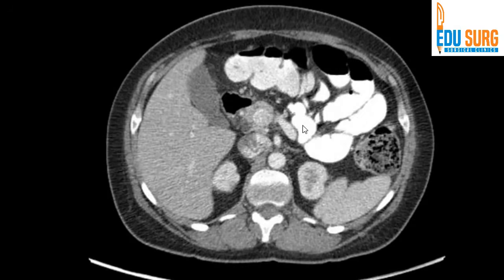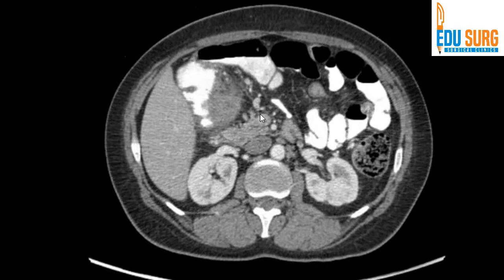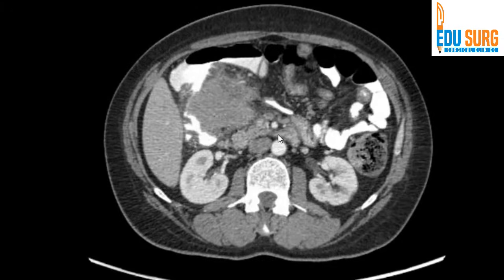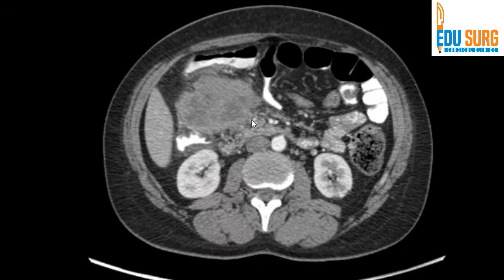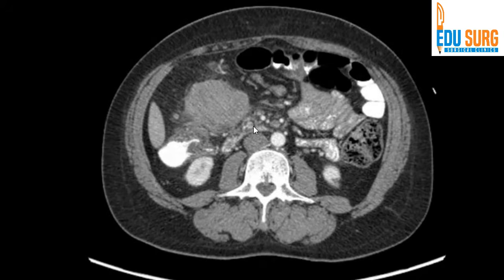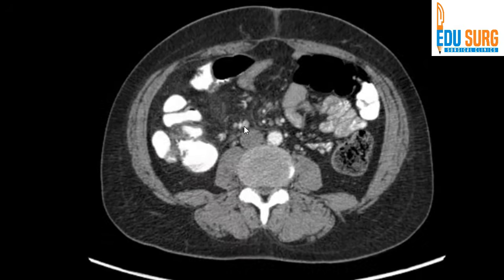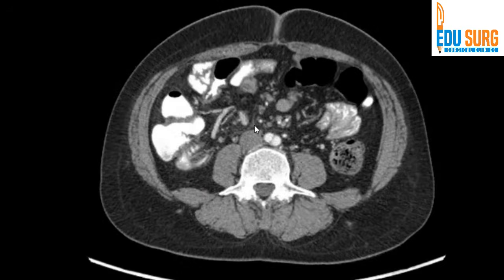So now going down, you can see the splenic vein, now the SMV, and the tumor is at points close to the SMV, but the plane is maintained. So you can see a good plane between the tumor and the SMV. Here it is divided into its two main branches. This is the branch that we are concerned with because it is the branch that is going to give the ileocolic. So now you can see the structure that we were discussing.